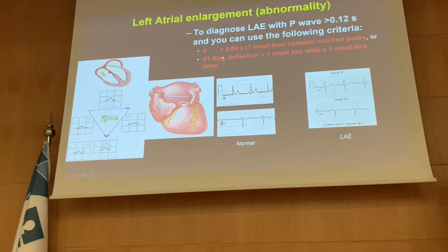So we'll go to a summary. In this normal patient, there is a small P wave, and in V1 there is a tiny P wave. But in our patient, who has mitral stenosis unfortunately, there are like two waves, one and two here, and there is a deep deflection in V1. A P wave is not doing this. For sure, and we're going to read the scenario, the patient has rheumatic heart disease, she has a diastolic murmur, and she is coming with shortness of breath. This cannot be anything except what we call left atrial dilatation.